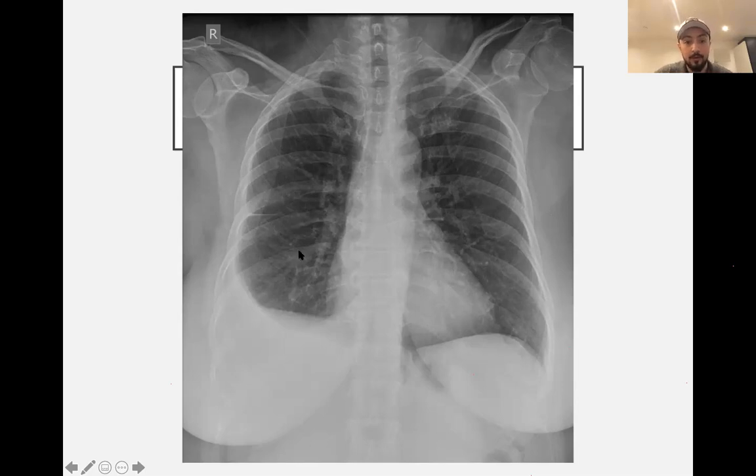So actually, can you present for me your findings? Do you know the format for how to present your findings? The way you present it is basically going through the whole thing like you did. You'd start with the patient's name and then the patient's date. You can make these up because we don't have the names and date. And then you can go through the rest like you just did, the rotation.